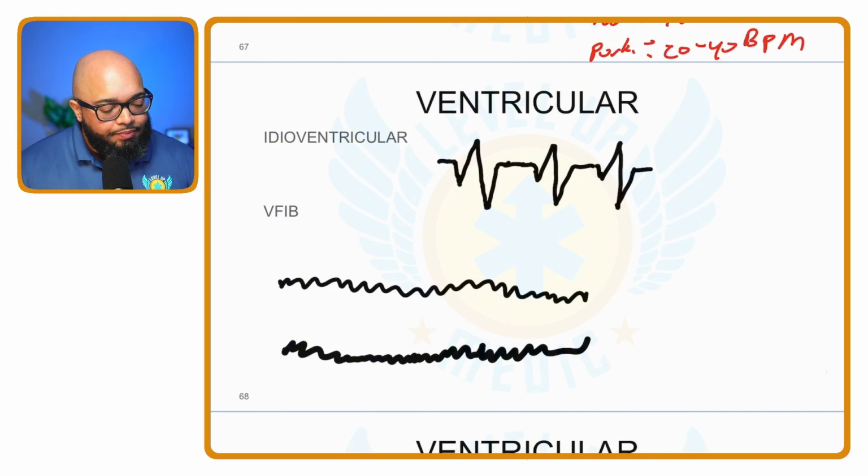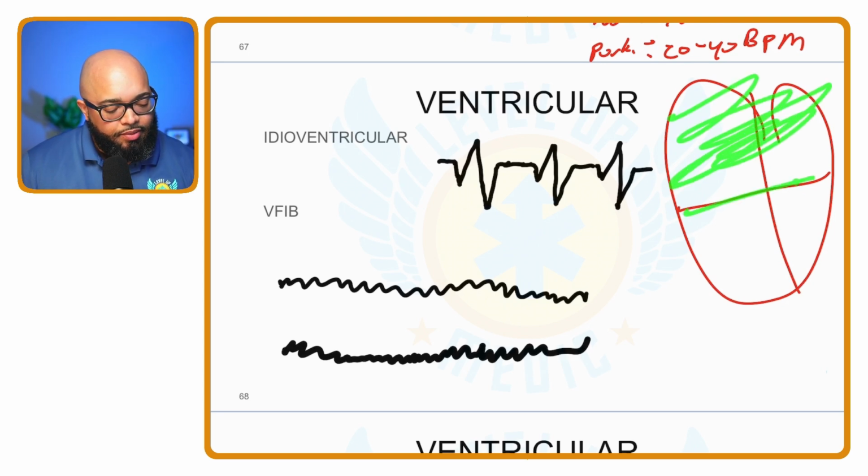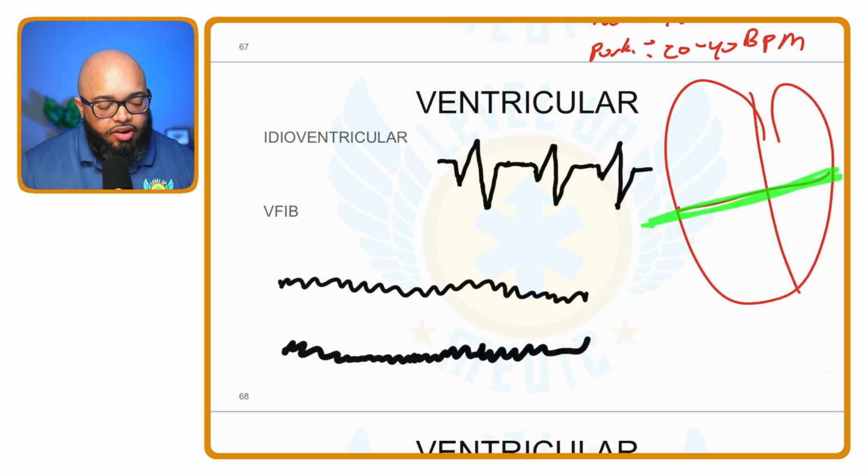We've been all throughout the atria. We just hit junctional. Okay, remember, how do we figure out junctional rhythms? They're going to have either what? Tell me. Come on, tell me. They're going to have either an absent P wave or an inverted P wave. If it's plain old junctional, what's the rate going to be? It's going to be 40 to 60.